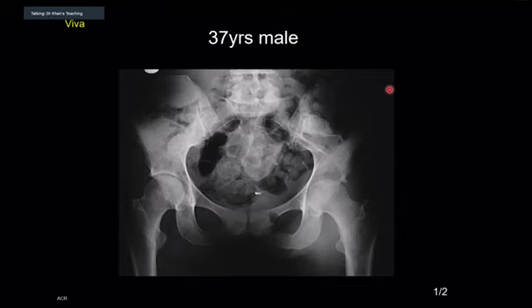And any other evidence? You've picked up one finding, so I agree the finding is there. Any other evidence that something is wrong? Look at the joint space, please. So the joint space is significantly narrowed compared to the contralateral side. So there's loss of joint space as well, which will be in keeping with a possible infection in the left hip. Right.